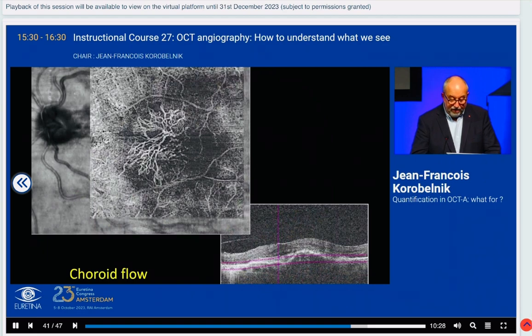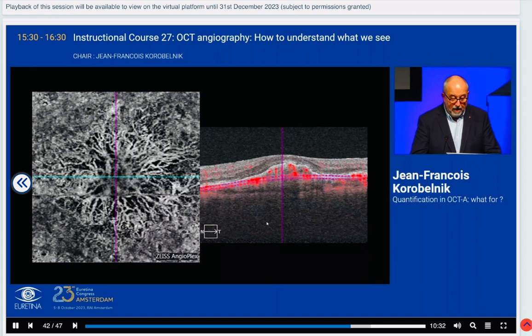And in wet AMD, this is quite obvious. You have the CNV. This has been shown very nicely by Nicole. And you can have those wonderful OCT images that were very fascinating at the beginning. By the way, I like very much the B-scan of the PED to detect flow in the B-scan. That's another way to use the OCT images.